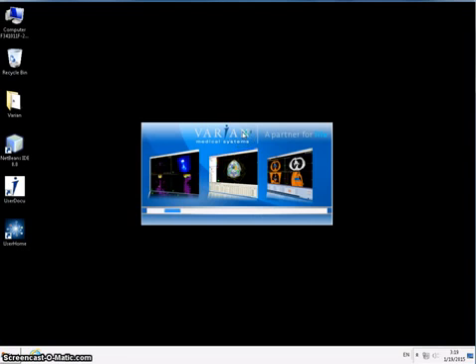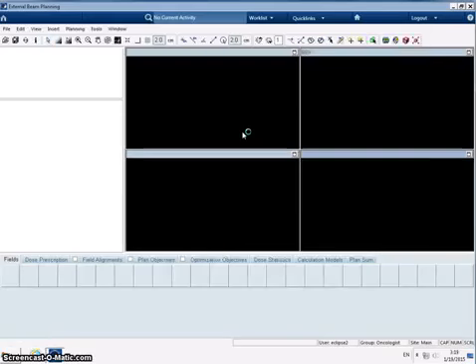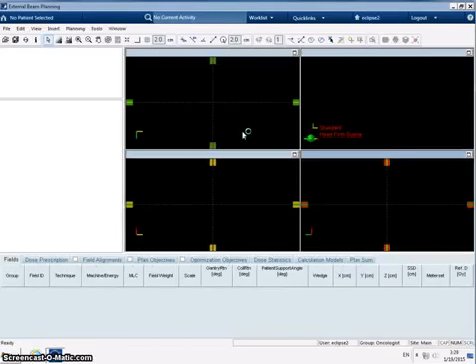So we're going to go to external beam planning, because I've already created a patient for you and contoured the patient. So you're going to have a go at doing some planning on a pre-contoured patient. This is what you might do if you worked in a planning department, where the clinicians contour the patients and then they move the patient data to you to plan the patient.